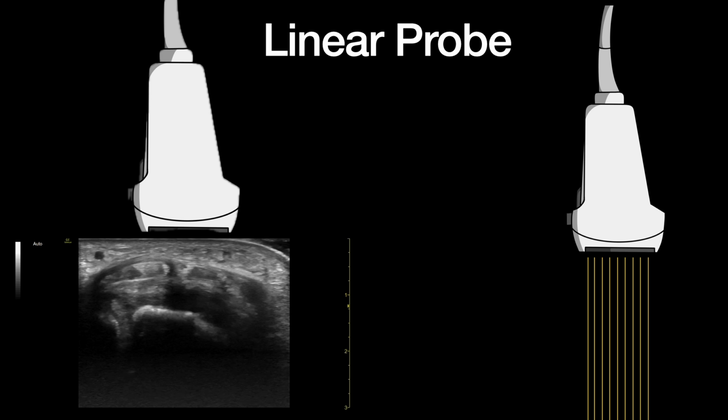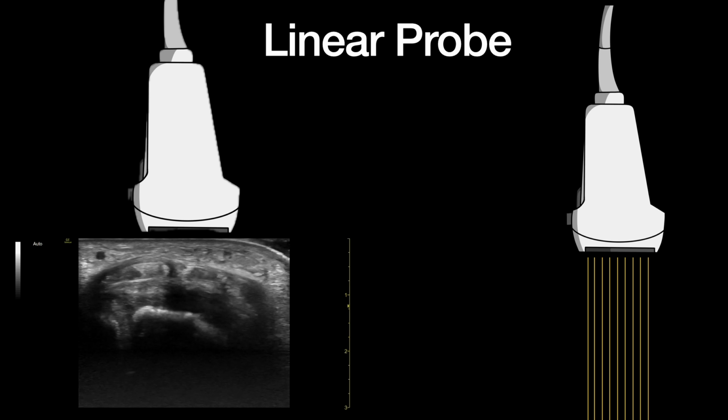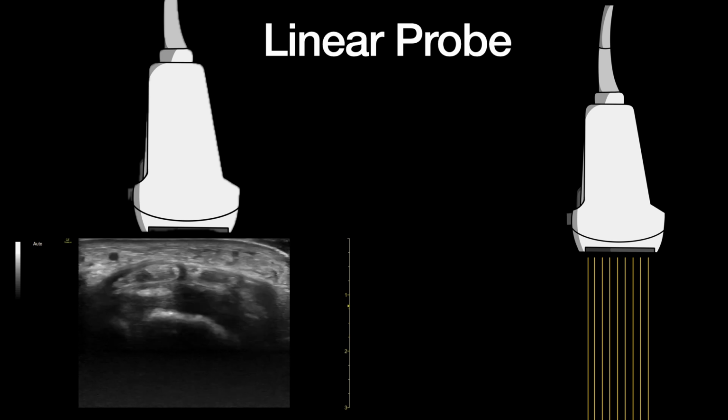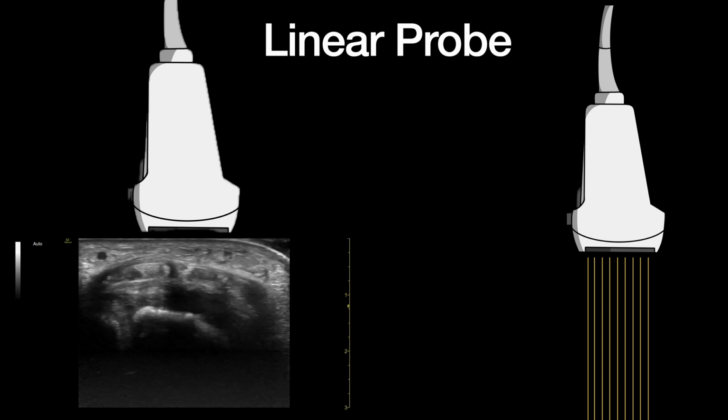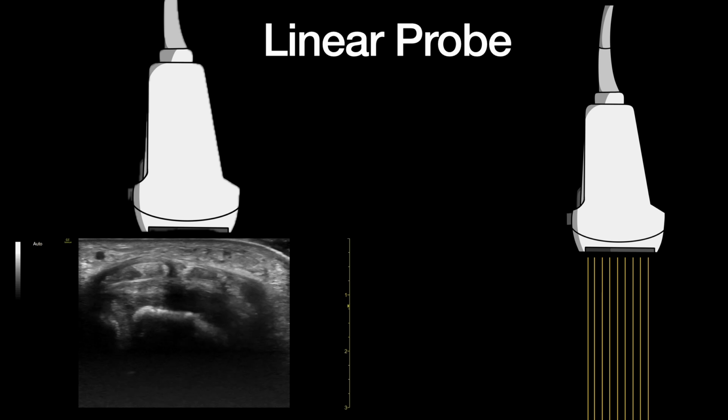This is very important also because now you do not have the decrease of the edge quality, and you have a very good quality at the center. This is ideal, for example, for any type of procedure like placing lines, doing arthrocentesis, or placing intraarticular injections. That's very important.